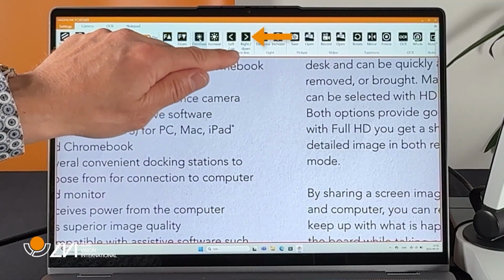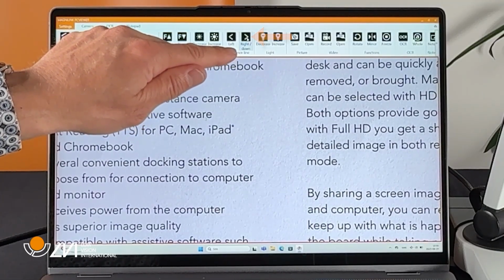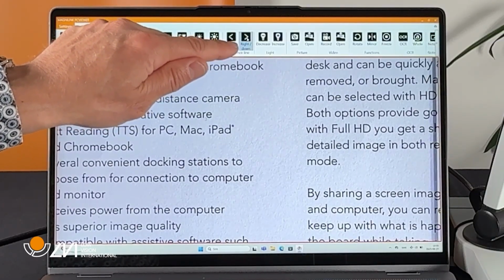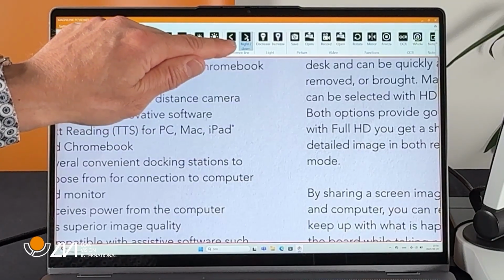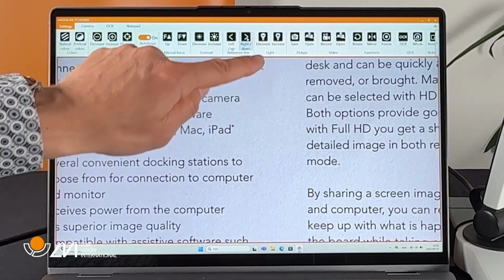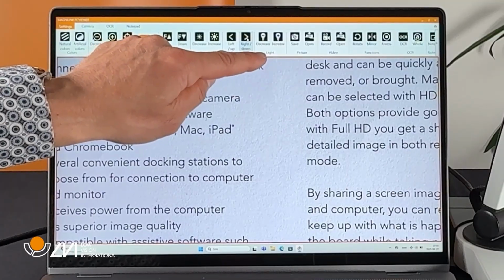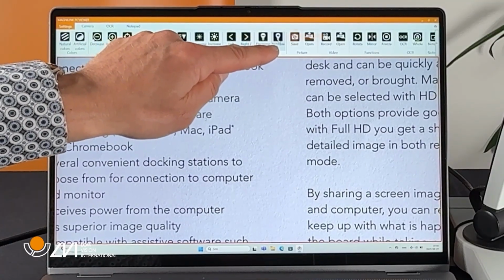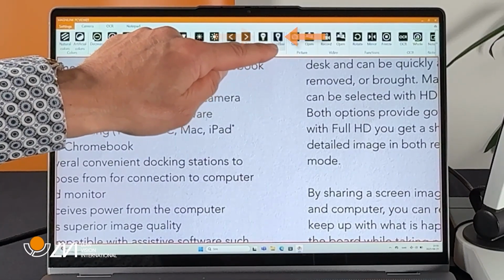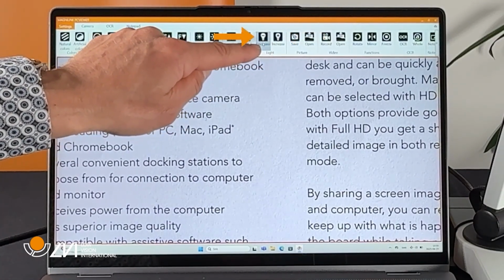These arrow buttons are used for reference line and curtains. Press to toggle between the different modes. The next two buttons with a light bulb control the light of the unit. Press them to increase or decrease the light of the unit.